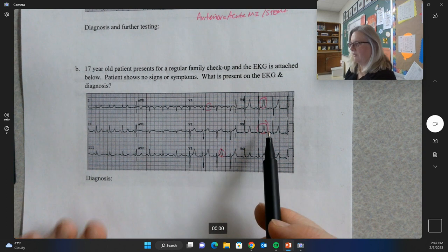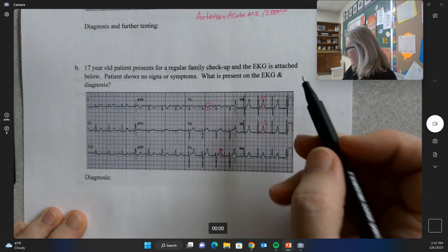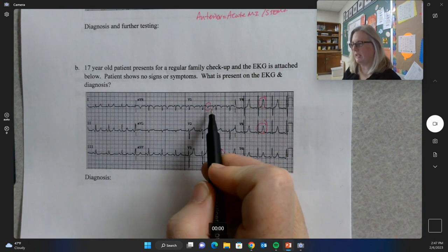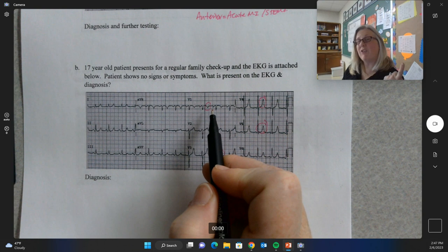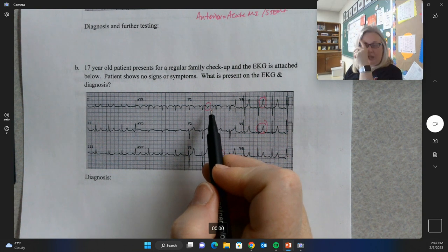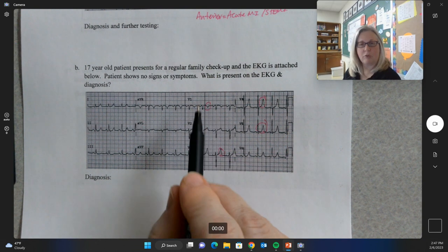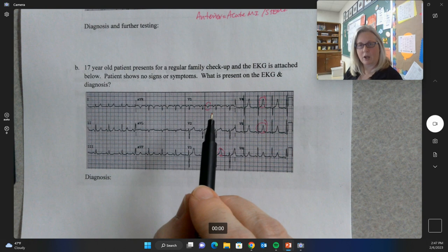We've got some peak T's. They're lower peak T's, but we've got some peak T's, right? So peak T's, and then we have one inverted T. So when you only have one inverted T, that's considered non-diagnostic. That's just his normal. It doesn't match with anything else. You don't have any inverted T's in any other anterior leads, V1 through 4, non-diagnostic.